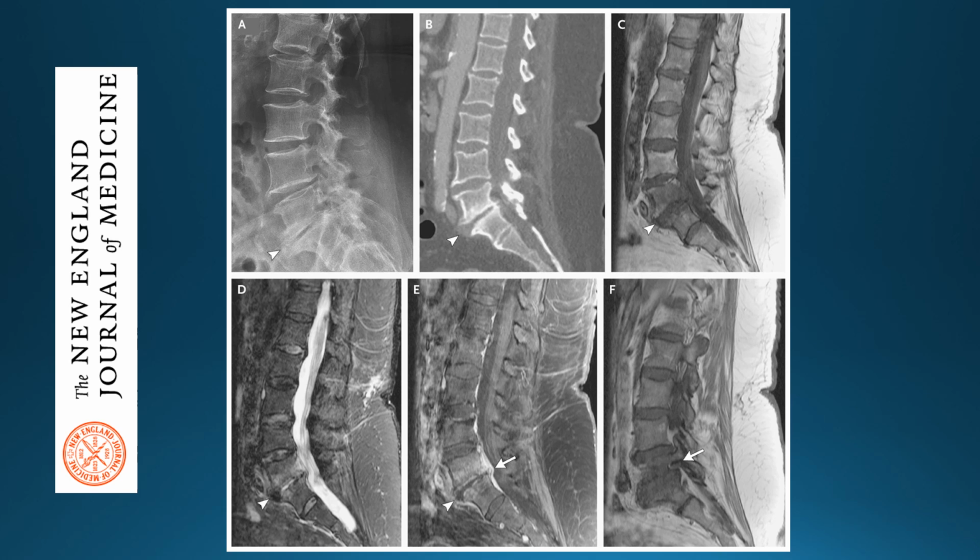This is one patient who has a discitis osteomyelitis at L5S1. You can see a little bit of prevertebral soft tissue thickening, as well as edema in the vertebrae, some bright signal in the disc. This patient had a history of drinking unpasteurized camel's milk, so you can get this from drinking unpasteurized milk.